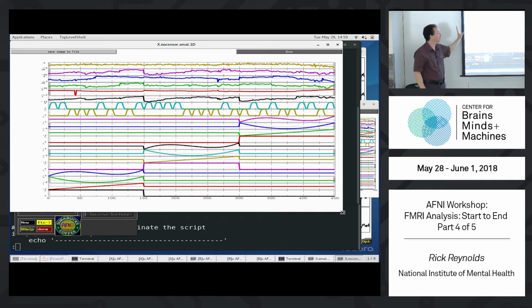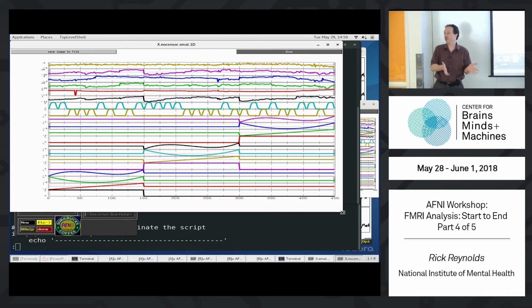So this data set contains all, you see it goes to the very end, all 450 time points. The normal X matrix does not. And we've asked for both to be saved on disk just so we can look at them and think about them. Any questions about this?